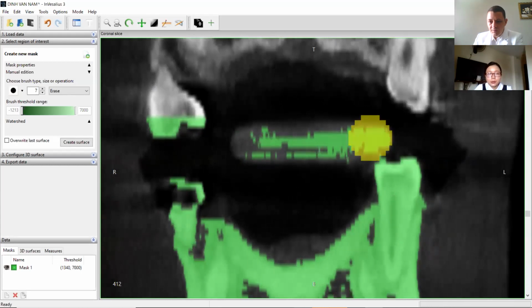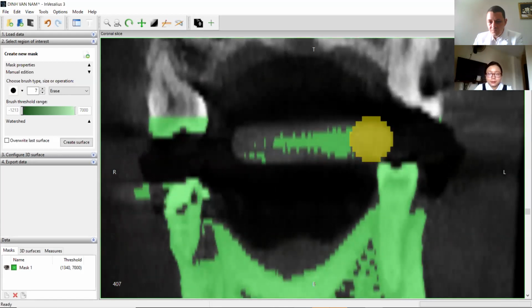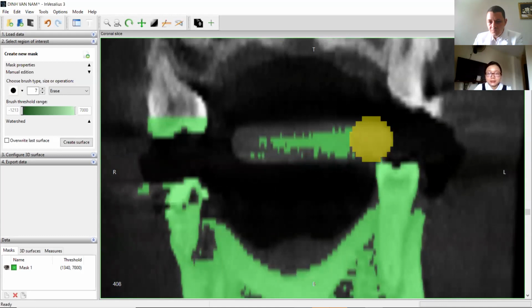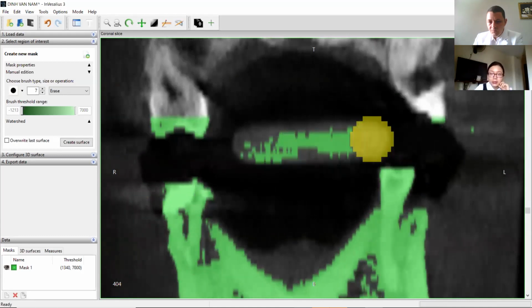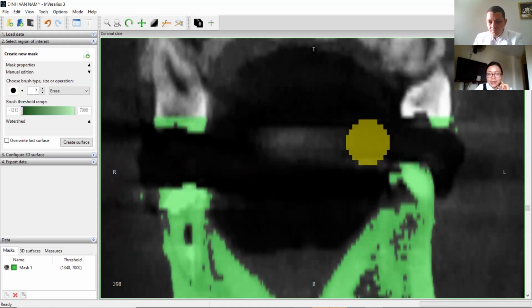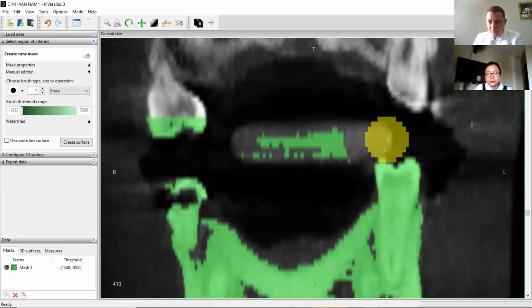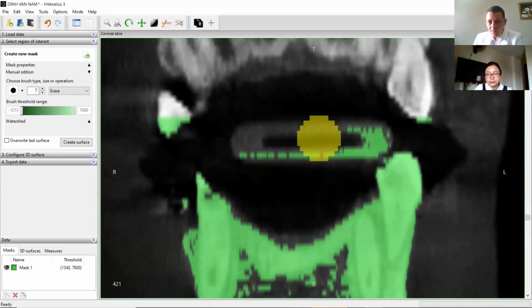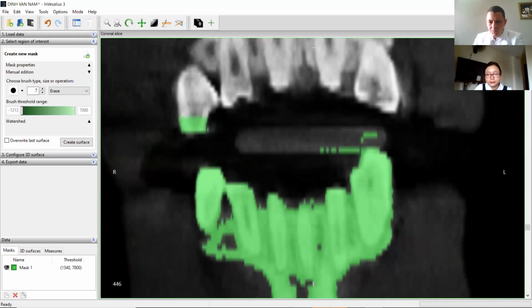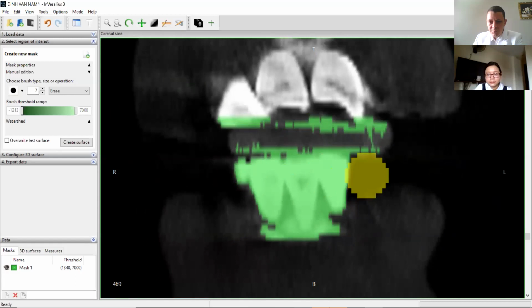Thì mình sẽ dùng cái chổi tương tự để mình xóa hết những cái phần mà nó chạm giữa cái răng và cái thanh cắn. Mình đi từng slide một để mình xóa nó đi. Thì ở đây thì bác Nicola bác ấy không có xóa hết cái thanh cắn đi, bác ấy chỉ xóa cái phần mà chạm giữa cái thanh cắn và cái răng thôi. Okay, here this one can be trouble. Okay, yes. I'm going to the end. Yes, this will be trouble 100%.